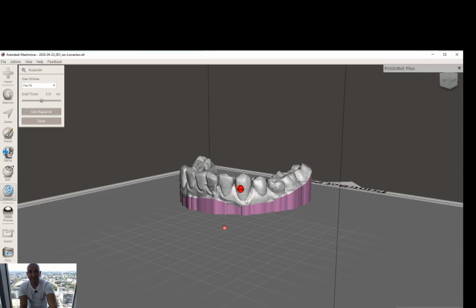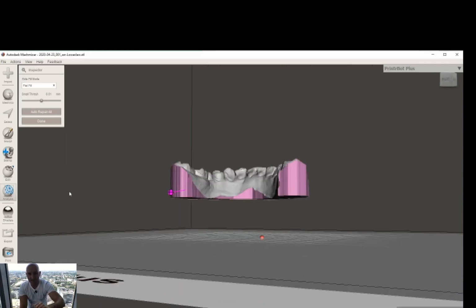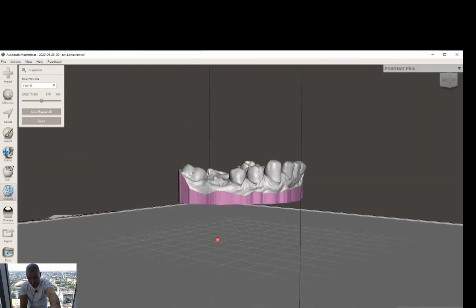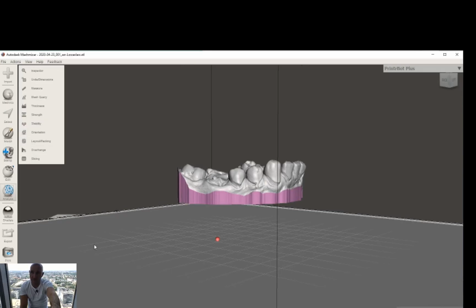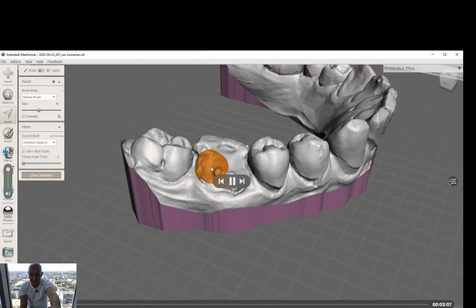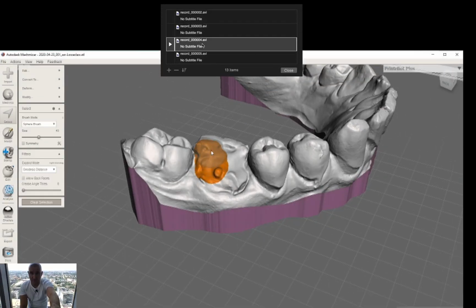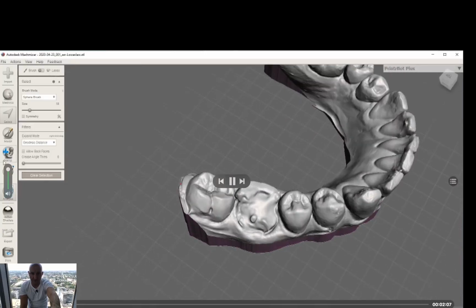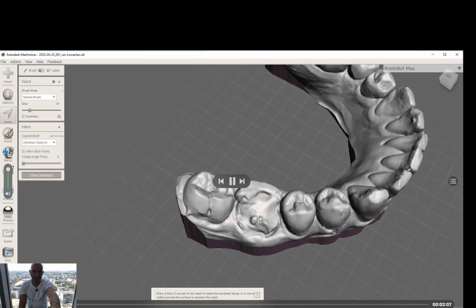which we remove out of the model, which we prepare our custom, not abutment but view of gingiva, and right after that, let me just check if it is the right video. This one is right. So we go like this.